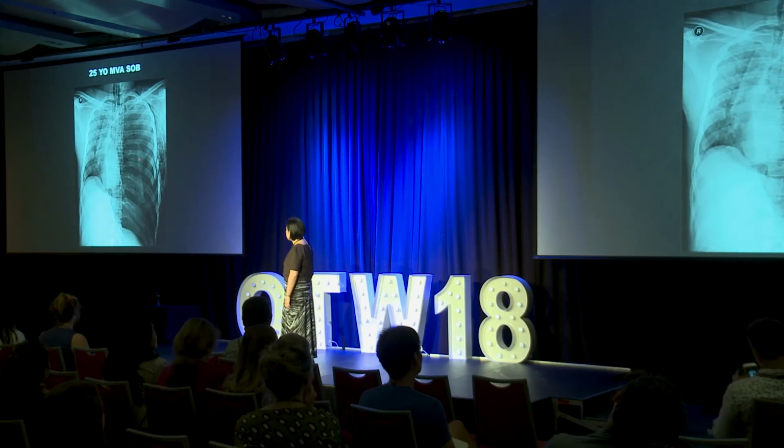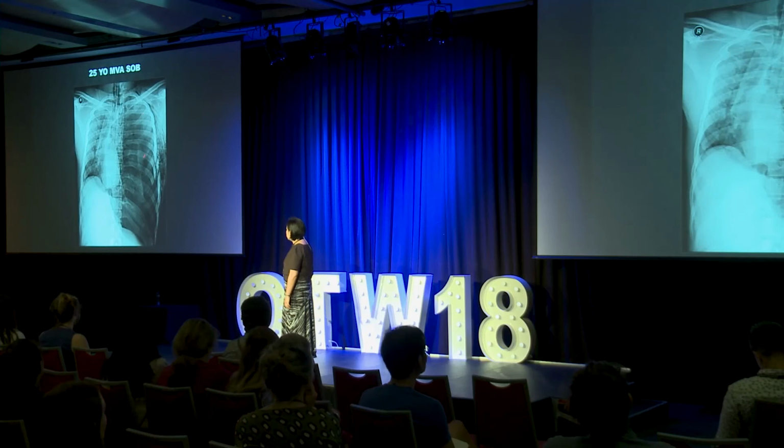There's a pneumothorax, that's the lung edge. And there's a large pneumothorax because the endotracheal tube and the whole mediastinum is shifted to the right. So it's likely that they've got a tension pneumothorax. Tension pneumothorax is really a clinical finding. We can certainly suggest it on an X-ray, especially if there's mediastinal shift, but we've had patients with a clinical tension pneumothorax who come in for an X-ray, and there is a pneumothorax there, but there's no mediastinal shift. So we don't tend to use tension pneumothorax in our report per se, because that's not really a radiologist diagnosis. That's more a clinical diagnosis. But we can certainly say there's mediastinal shift.